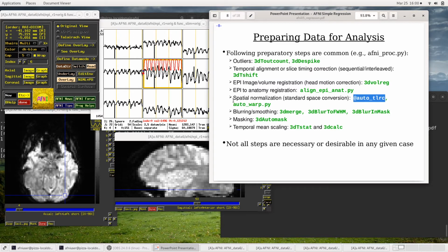You still get a lot of variance in the folding patterns, or even just in how well the sulci and gyri will align across subjects when aligning to your template. So one particular part of the brain, the location of it will still vary a little bit across subjects in standard space. And so if you blur the data a little bit, you make your blobs a little bigger, and then the blobs overlap a little better when you're running your group analysis.